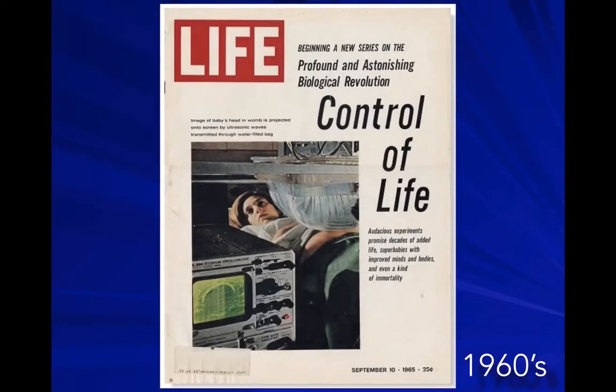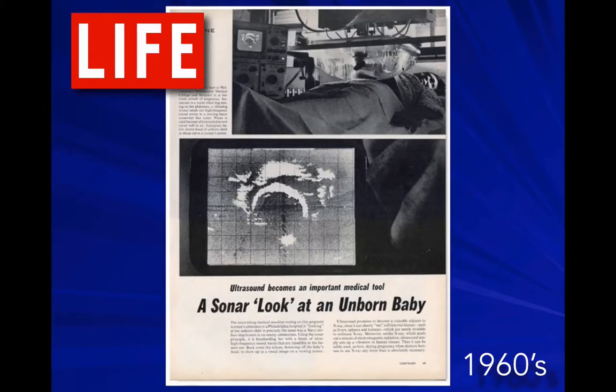And in the 60s, Life magazine put out this article on the control of life and how to look into the body. You see this lady here. There's a big bag of fluids with an ultrasound probe in there, and there's what is the fetal head there. So obviously the initial ultrasounds were done for pregnancies probably. And there's again this bag of water over here, from the days of submarines and the sea, and that probe is there. So the whole bag of water was actually touching the patient. And again, this is a fetal head.